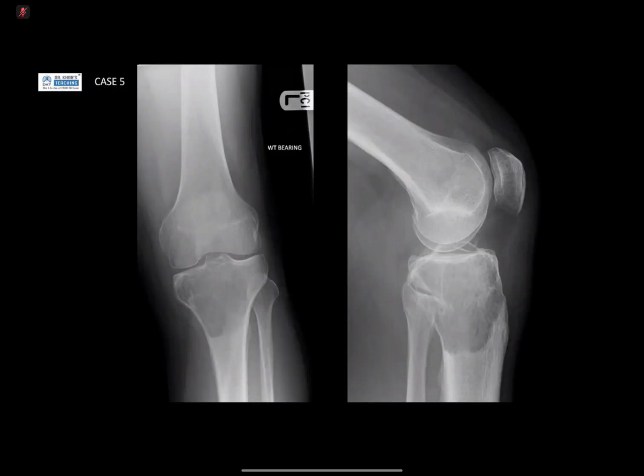The medial proximal tibia. In the AP view, I don't see cortical breaching. Not clear cortical breaching here. No, I think there is some, but it's not definitive periosteal reaction. It's not clear for me. Okay. But however, comparing the medial aspect of the cortex to the lateral cortex of the tibia, I think there is a thinning. Could be some thinning of the cortex in the medial aspect here compared to this lateral aspect.